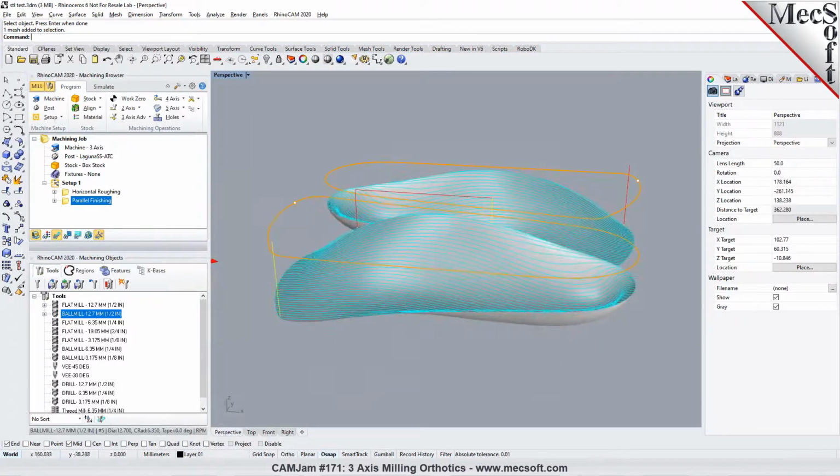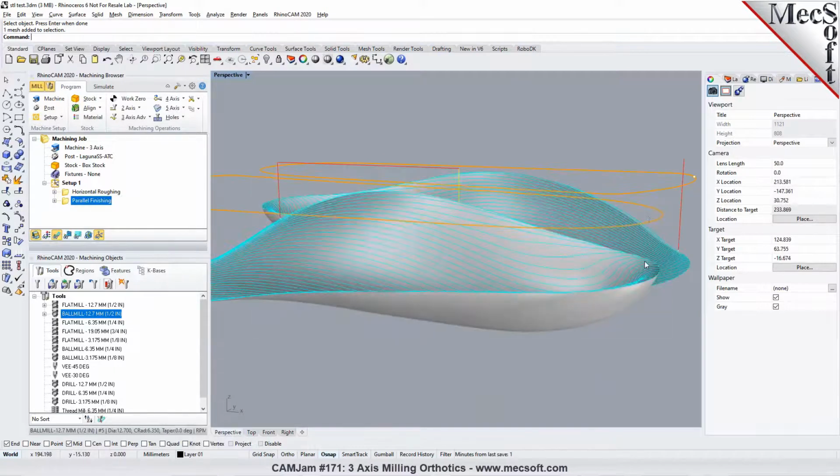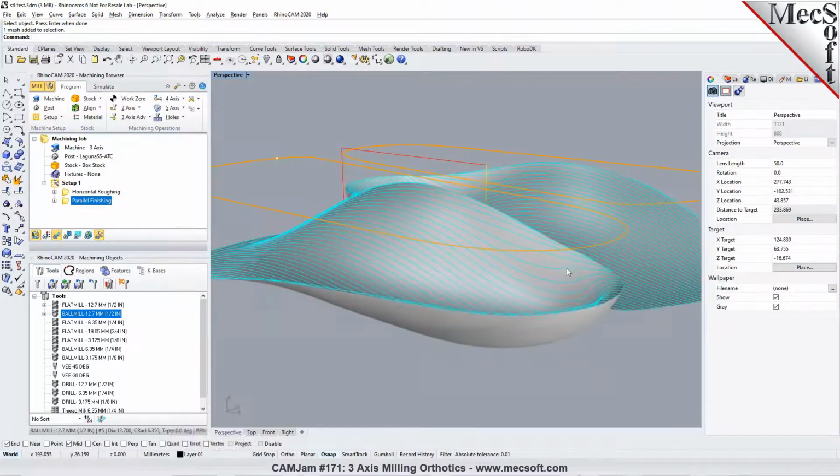No, well, make like a heel cup go a little higher. The cutting, you want it to go higher? Yeah, because usually we leave the heel cup sometimes a little higher, or a little deeper. Could we do that? Yeah, you'll have to make that change in the design, and then the machining is generated for what you've designed here. So you'll have to modify that in the design.